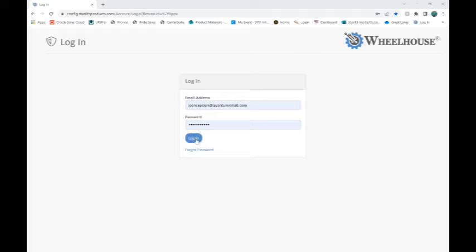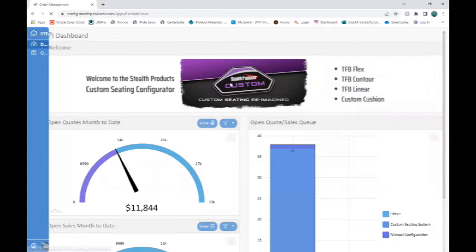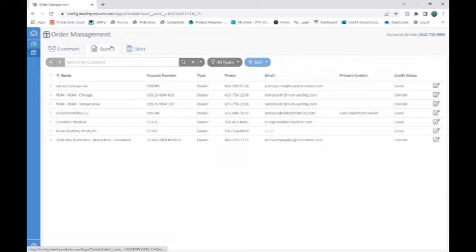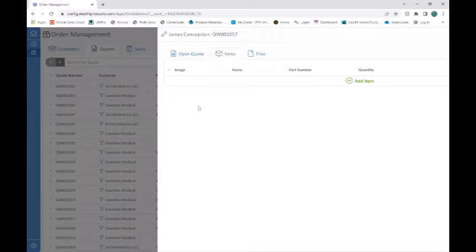So I'm going to move right into the quote process here because, as I said, the previous video covered all those things. And I'm just going to spec out a quote and we'll walk through that. So I'm not going to go into any of these other things that are here.